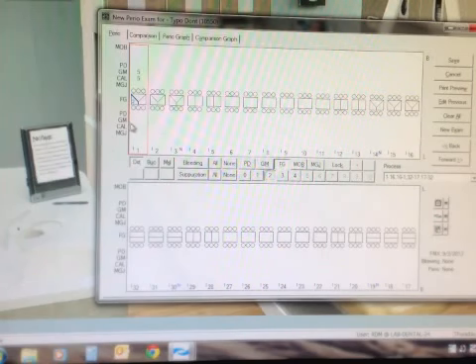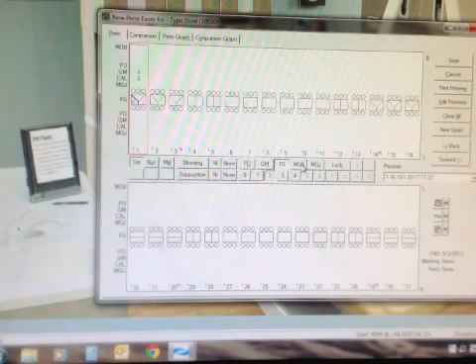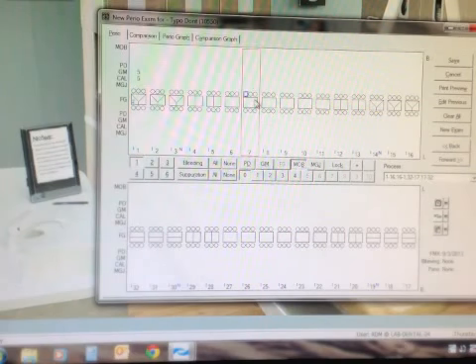After charting all the furcations that present in the patient's mouth, you are able to move on to the mobility. Click the MOB button. After clicking the MOB button, you are able to select the tooth that presents with mobility. For example, I am selecting tooth number 7. After selecting the tooth that has mobility, I am able to go back down under the MOB button and select the class that the tooth presents with. For example, tooth number 7 presents with a class 3 mobility. It will then chart the number 3 on the top of the chart.